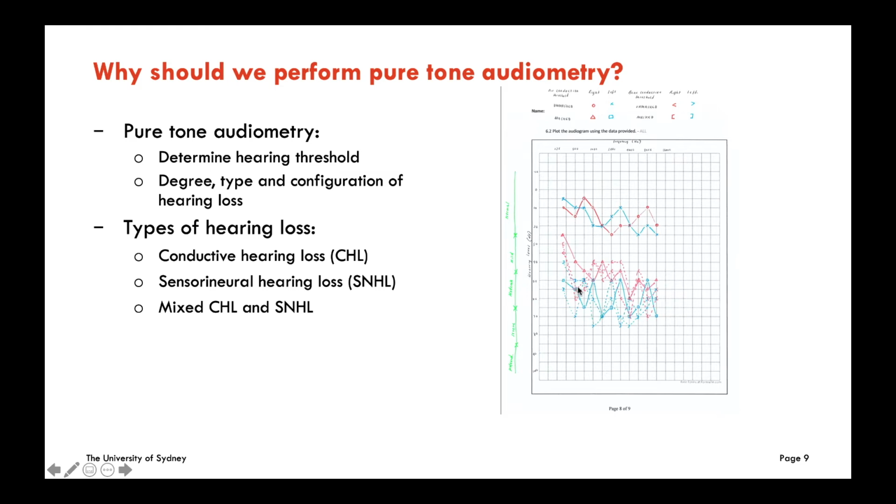So in this case, we're talking about a hearing threshold that is mild to moderately severe in the left ear. We confirm this by doing bone conduction on its own, and again bone conduction with masking in both ears. But the pattern is more or less similar if we do the assessments of bone conduction.